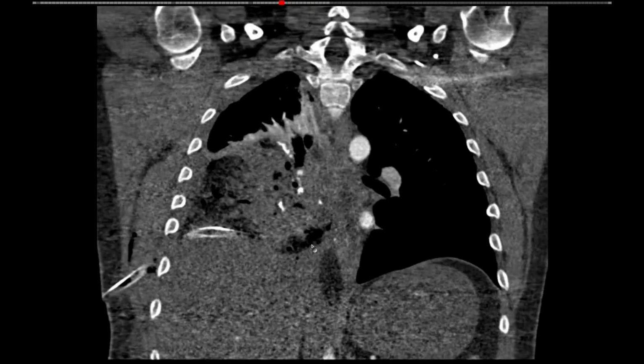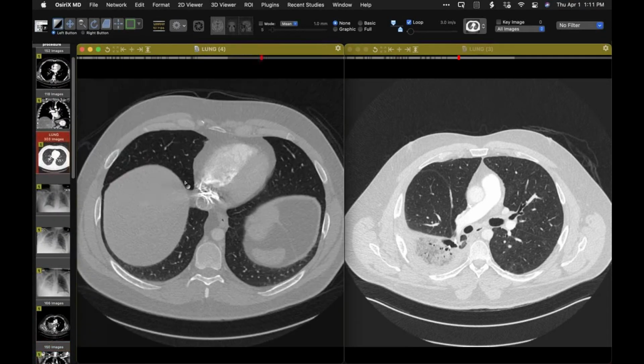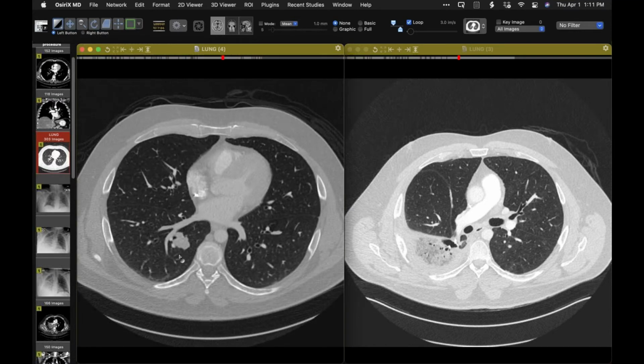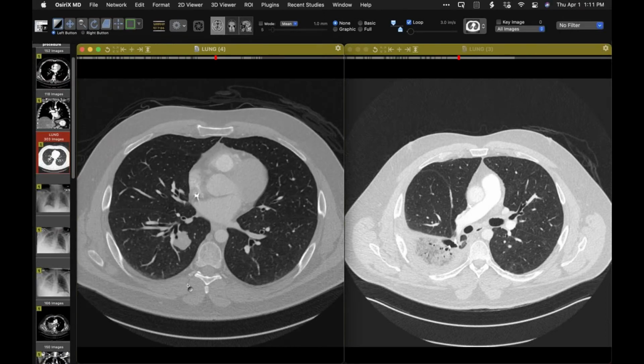What was the surgery for? To remove a metastasis. It was just meant to be a wedge, and they somehow knocked out the. Well, they took a generous amount of lung tissue out, but you can see that it's a pretty central metastasis. They should have just, well, he got his lobectomy, I guess, one way or the other.